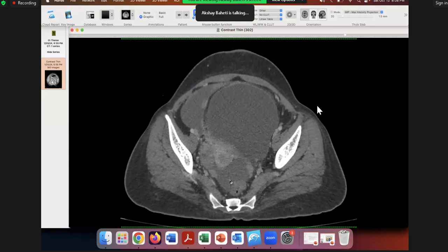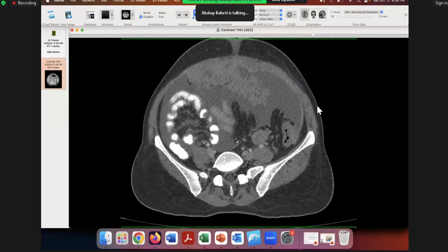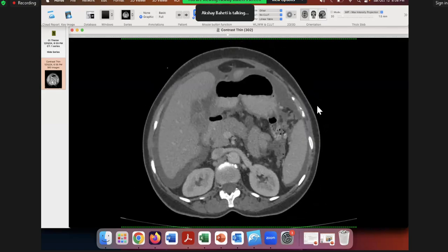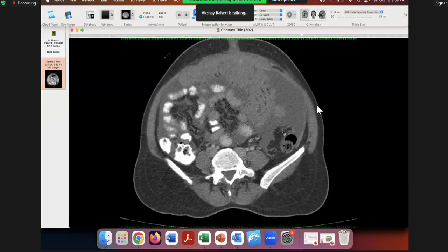So at baseline, it's very easy because there's a lot of disease. They will operate this patient. The patient will go into follow-up. The patient's CA125 will be normal. And then after maybe a year or two, usually between 1.5 to 2 years, the patient will come back with rising CA125. Now the marker is 70, 100, 120. And then they'll ask you, they are sure there's disease recurrence somewhere. Where is the recurrence? And that time, often it's just some subtle nodularity here. So that's when it gets more difficult, and you have to really look at everything very carefully.